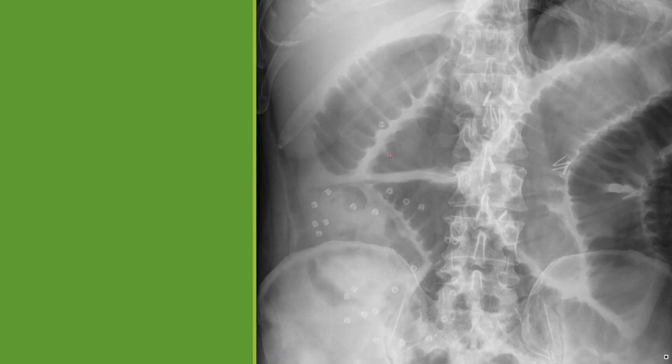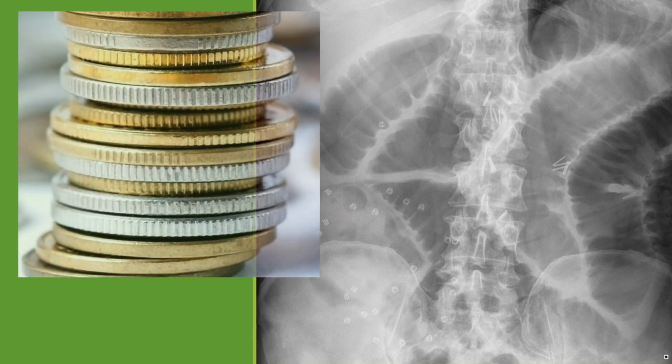When you see it on X-ray, you look that all the intestine is in the center. Great, and maybe I can help you with this one. This and this, it's the same.